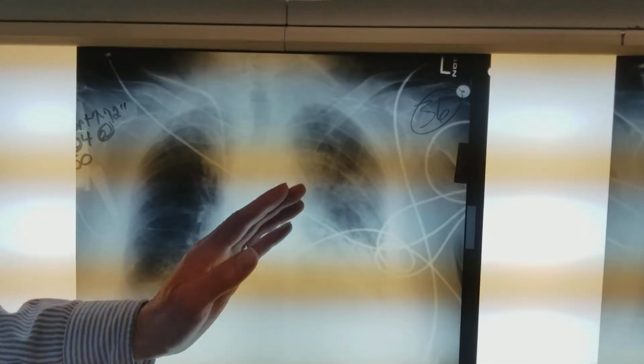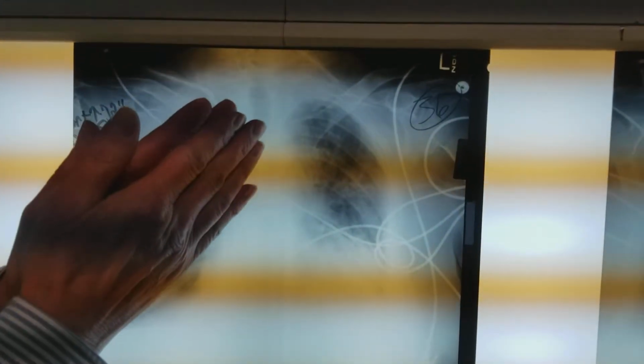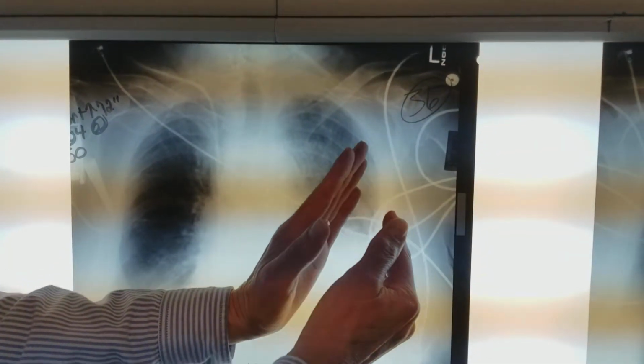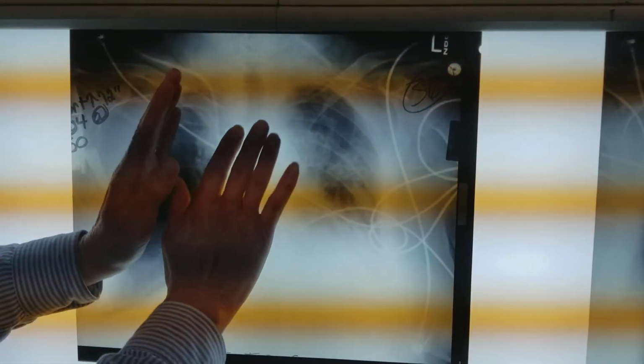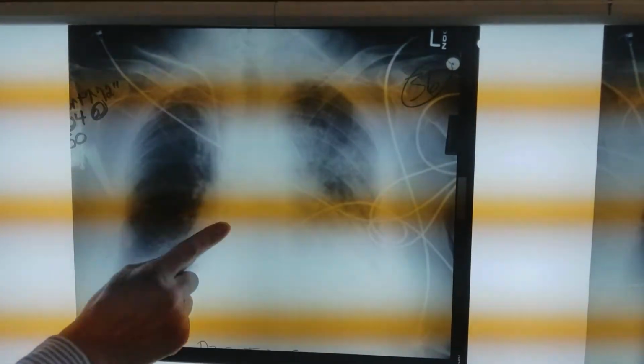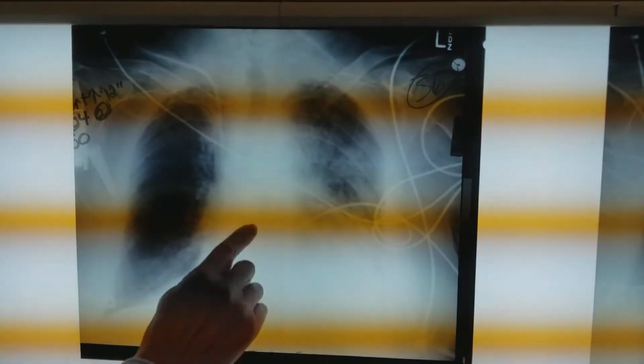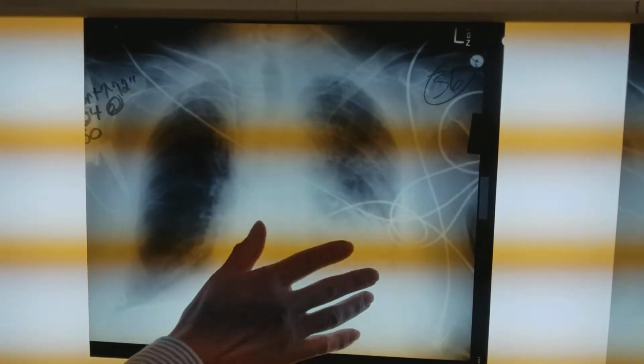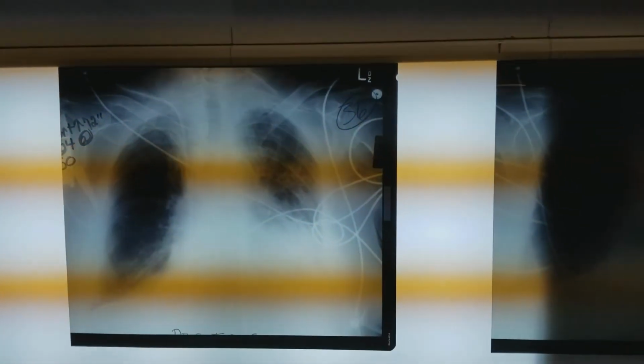Anything outside the lung, meaning in between the pleural space, whether it's air, blood, infection, fluid, whatever it is, pushes everything in the middle away. And you could kind of see that happening here. Because here's the sternum. See this guy over here? This is your trachea. So it's getting pushed away. This is more than likely a pleural effusion, which we want to do a lateral decubitus to really determine that.